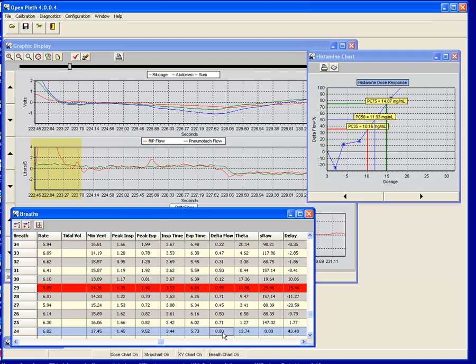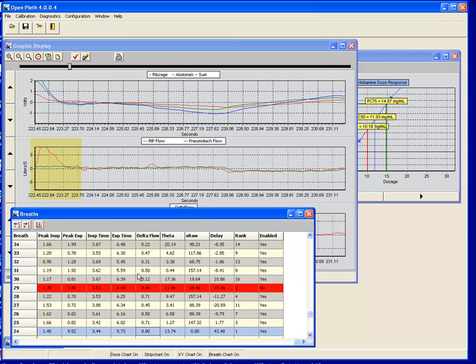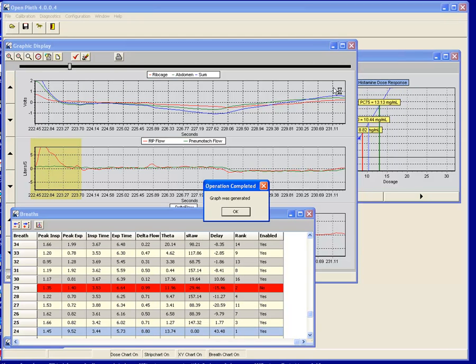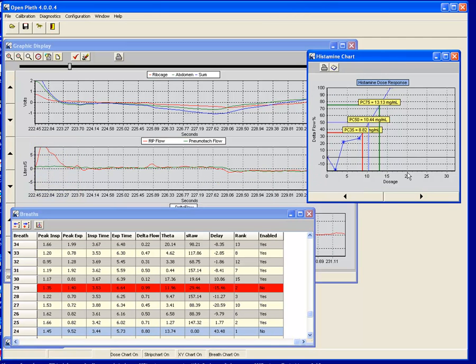And this one clearly has a problem. Let's see. And so we will remove it. Did I get the right one? Yeah, this one here, and remove it. And we can see our graph starting to look a little bit better.